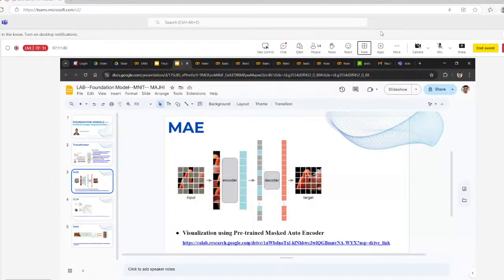So okay, installing a few packages, and this is the package installation. Here there are three main functions to see an image. For example, the image you load, you see, and then preparing the model that we want. So this is the MAE ViT large with a patch size of 16 by 16. So we take this model, we load the checkpoints, and you can choose the resource either as CPU or GPU, but let's say for one run, CPU is enough.